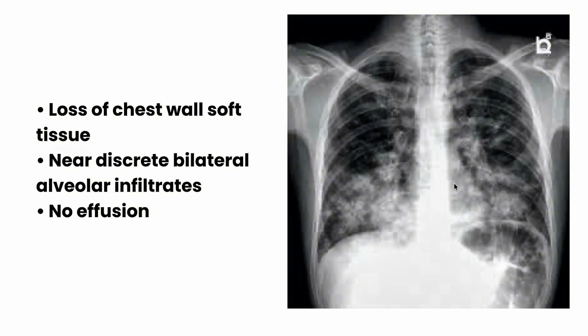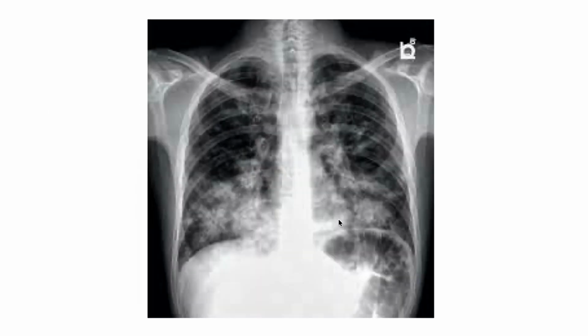For example, you quickly say these are lung infiltrates. I want to conclude that these are probably pneumonic in origin. But again, like I said, to make a good report, you systematically look at all the other aspects of the chest wall, the soft tissues, bony structures, and the rest.